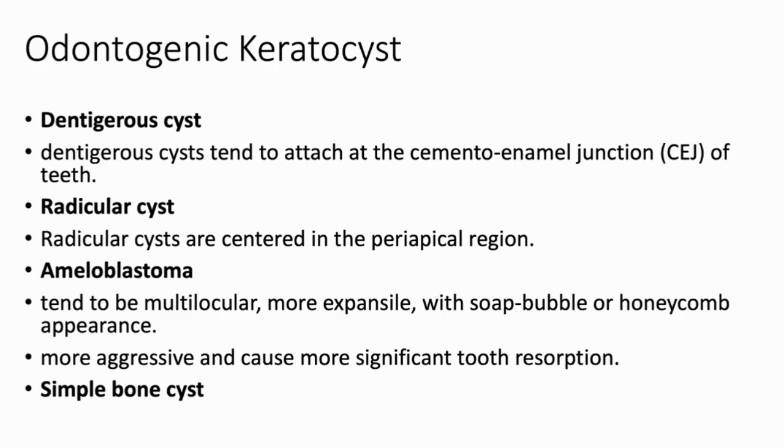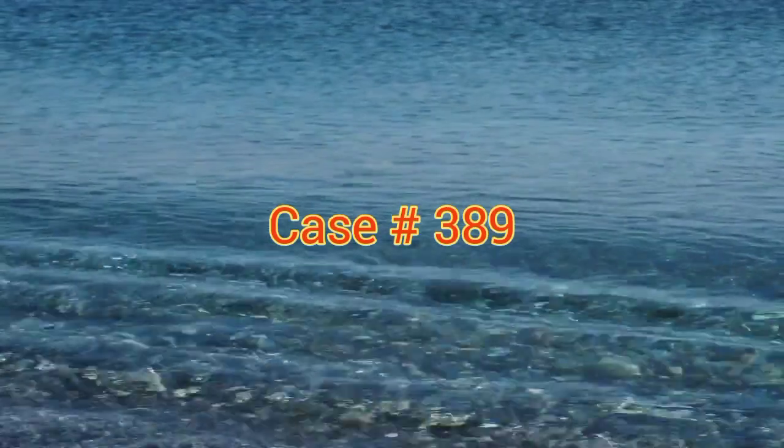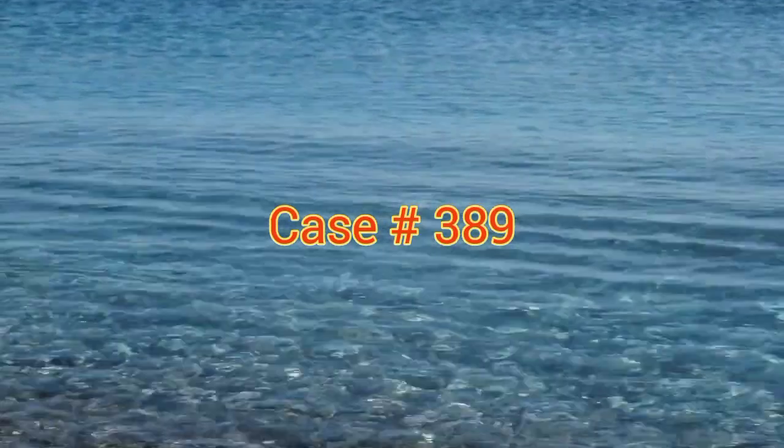So these are the differentials for a cystic lesion in a mandible. And you have described nicely on the radiograph, OPG, and also in the CT scan. Thank you very much.